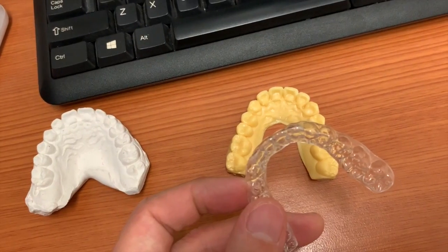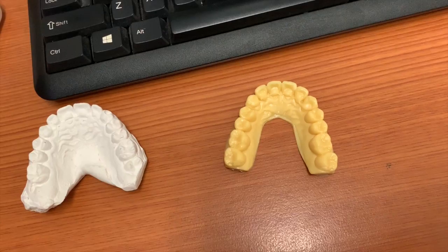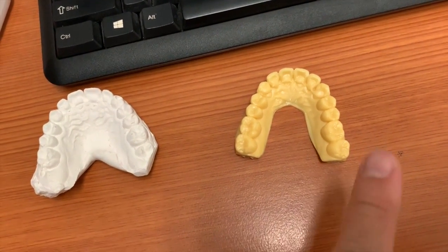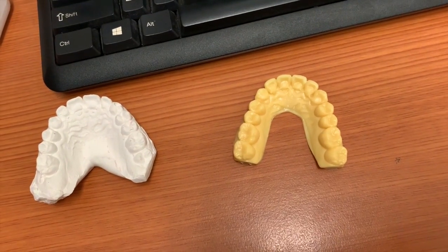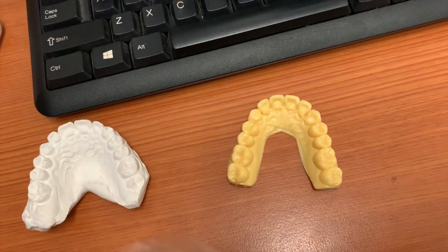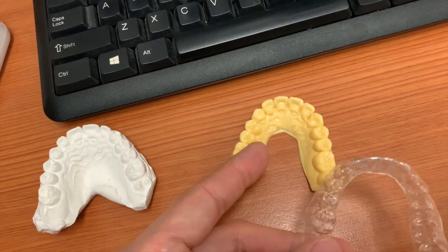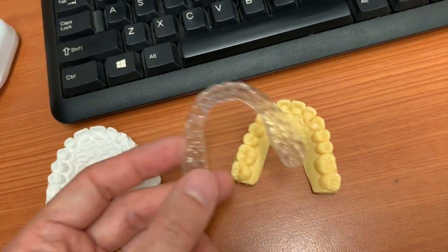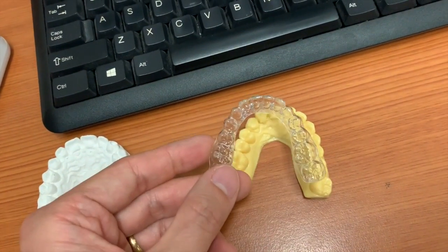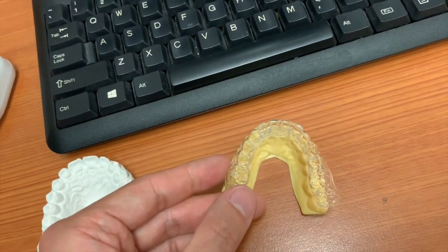The second benefit is that the models last a much longer time, and thereby you can keep them with you and bring them in, and then we can make the retainers to the same shape and positions of your teeth, so it reduces the cost to you for making these retainers. You also have peace of mind knowing that, let's say if you lose your retainers and a minor tooth moves, having these made to fit your teeth will still allow them to put some mild, gentle pressure to help straighten them back.